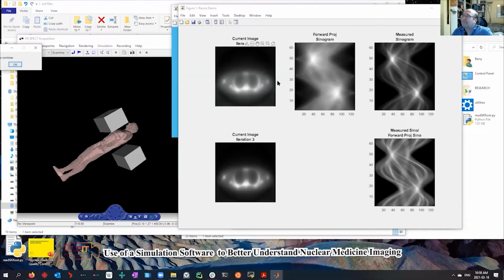And so we then forward project this, and the sinogram is beginning to look more and more like the measured sinogram. The ratio is still complex. When these get really close, this ratio should almost become uniform. And then this is what the image looks like when we back project this. So this is after iteration 3.